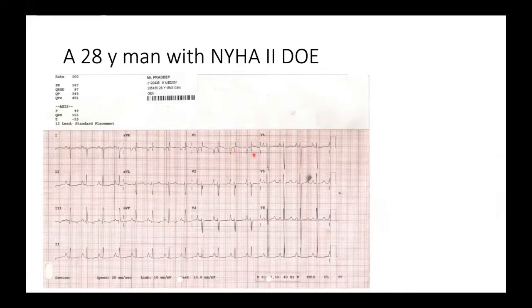The one important exception in this ECG is, if somebody sees suddenly this negative deflection, they will tell that there is a left atrial enlargement also, which is not true in this case. And why? Because there is one important thing which is known as the pseudo left atrial enlargement sign, where you see that there is a sharp deflection in this P wave.